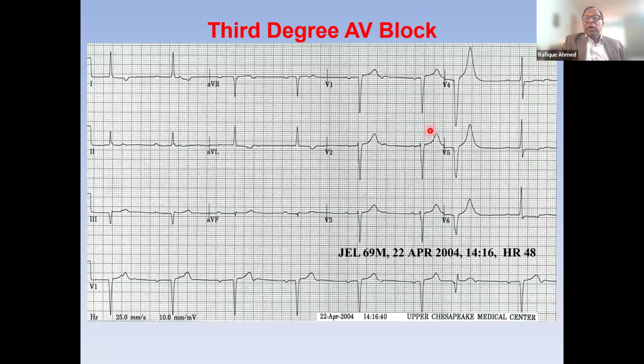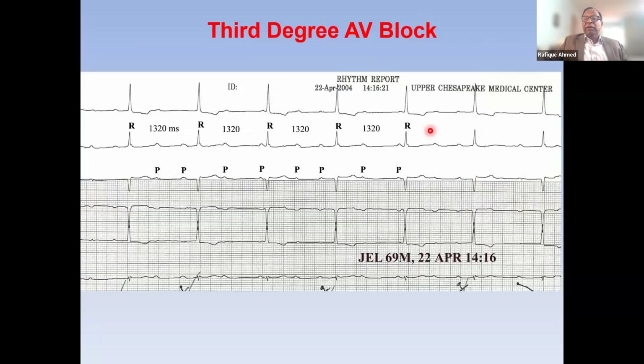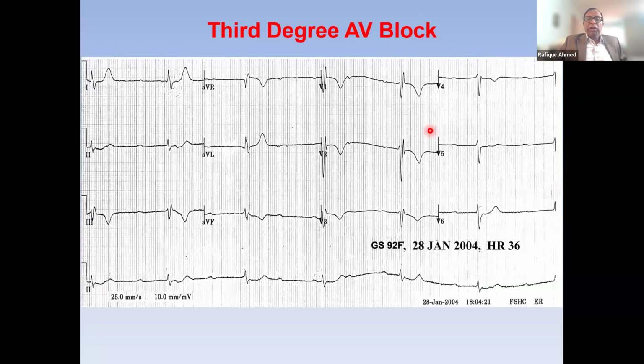I worry about cases where they come with complete heart block with left bundle morphology pattern, because if I knock out the right bundle, then I can produce complete heart block. Otherwise, this patient can just go for a permanent pacemaker implantation. So this is another patient.